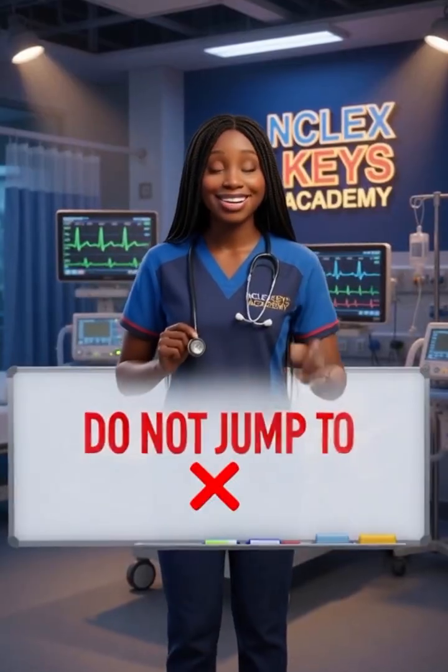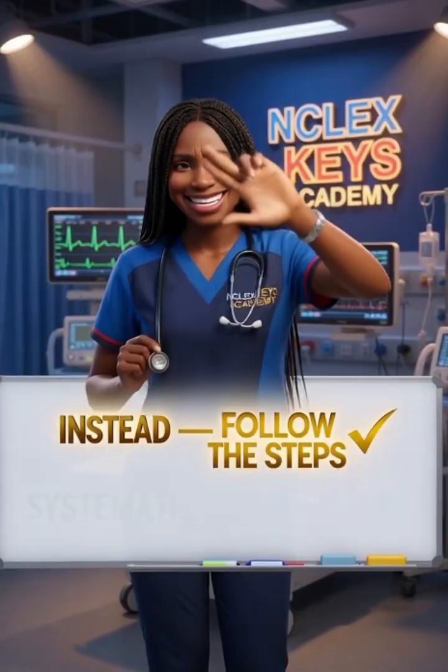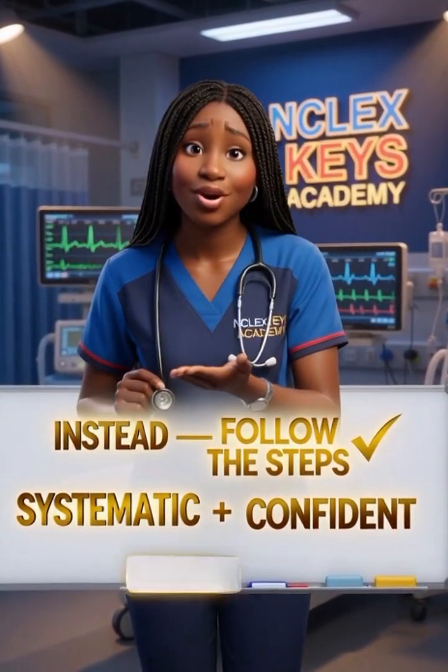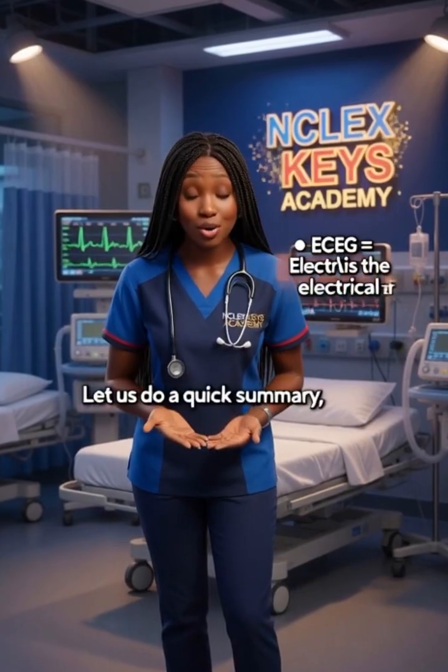Most importantly, do not jump to conclusions. Always follow the steps. Read the ECG systematically every single time and your interpretation will always be accurate. Practice makes perfect. Let us do a quick summary.